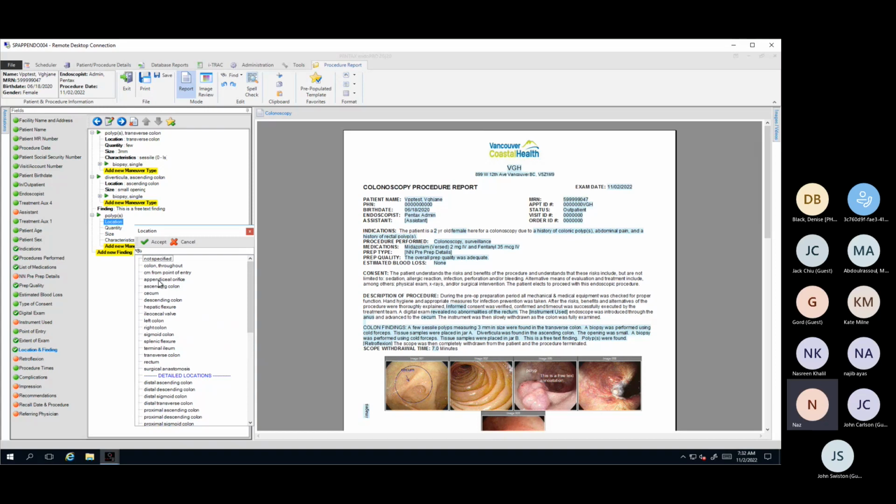This way somebody has to read the entire report to figure out you took out 6 polyps, what their configuration was and what you did. Whereas what we do right now is we just annotate it: number 1 this, number 2 this, number 3 this.